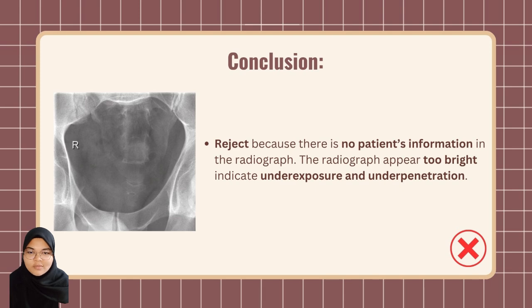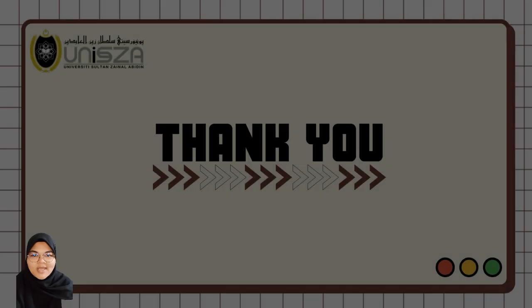Also, the radiograph is too bright, indicating underexposure and under penetration.